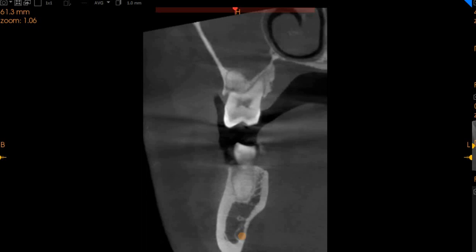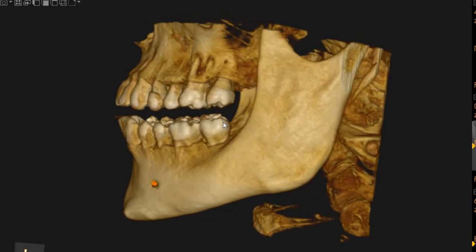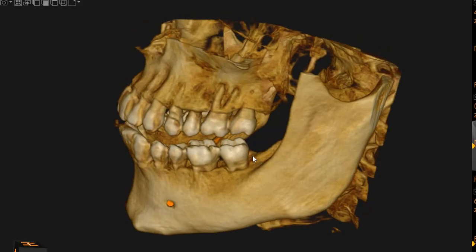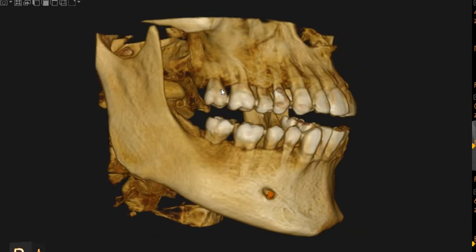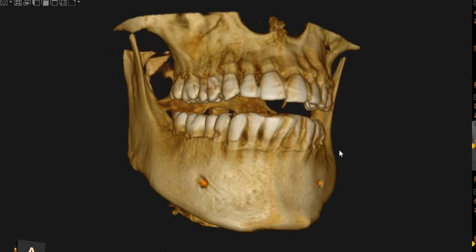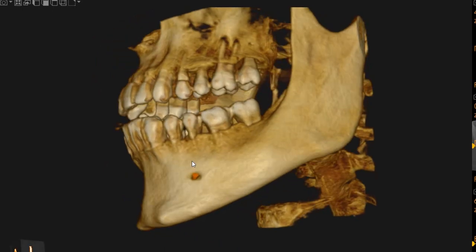So this is what we have seen in this patient's CBCT. The bone quality is poor in the upper posterior jaw bilaterally because of severe periodontal disease. And as you can even see on the 3D rendering, we've got thin fenestrations in the bone, and you can see angular periodontal defects and bone loss due to periodontal disease.